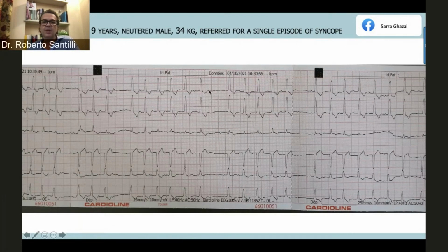So it can be either an artifact or an atrial ectopic focus that is firing here at this rate. Then another here, here, here, here, and then we have a dropped P wave here and suddenly stop and then start back here. So if you look at the PQ interval, it's very similar. So maybe there is just a slight increase here. So it's a first degree AV block, but I can consider this an AV association. That means that this is a normally conducted QRS complex, and so it's a bundle branch block.